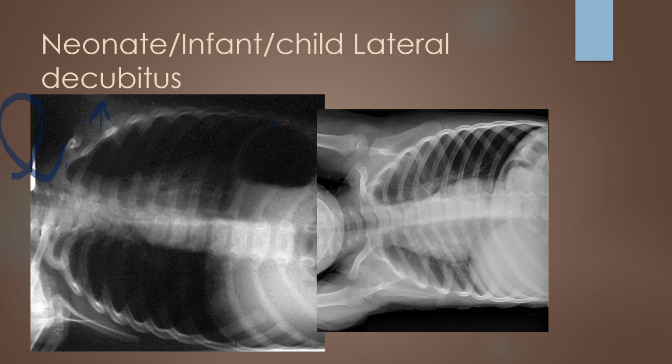What really is catching my eye here is this is ripe with quantum mottle. So I'm looking for soft tissue detail, bony trabecular pattern, good lung markings, good penetration, good cortical outline. And what I'm seeing is a very high contrast image with no lung markings, telling me that I don't have a long enough grayscale.